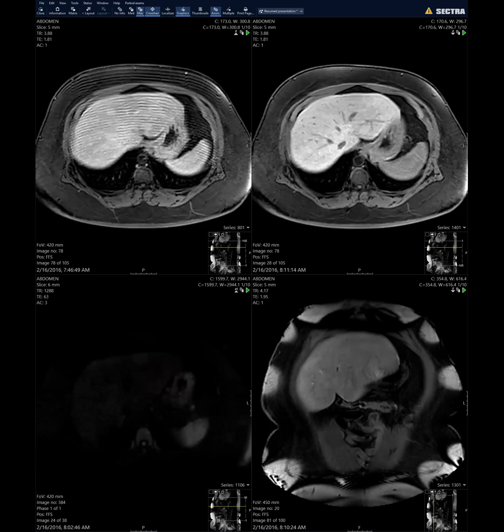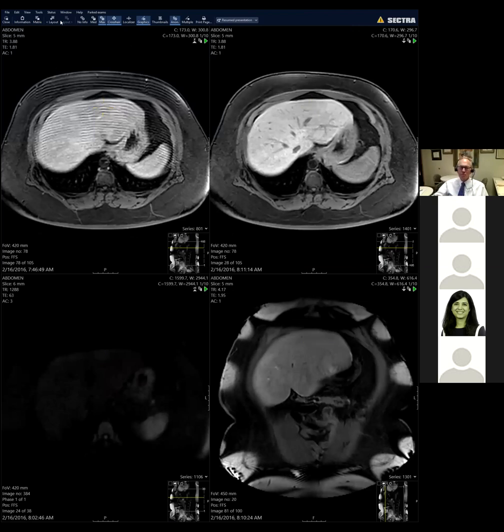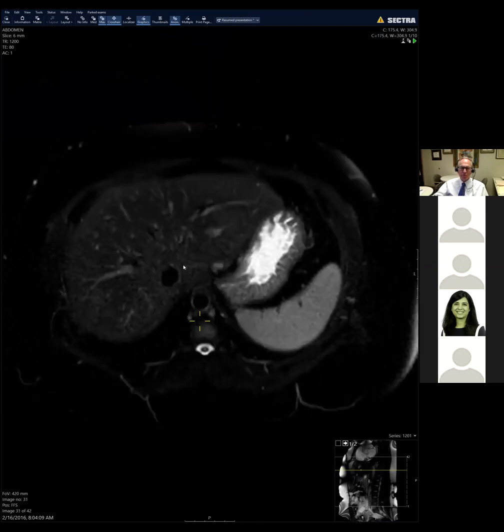And there's this one more case. Yeah, Gitanjali, I think that's a really good challenge. This is a great challenge case because, for example, is it FNH? Are they multiple FNHs, or are they nodular fat sparing? And Victoria says she's here and she has cases. Can you pull that last case back up and maybe see if Victoria has any comments? I'm sorry, the meeting ran over. No worries. Gitanjali, you can present.